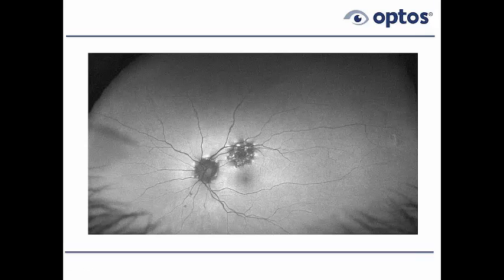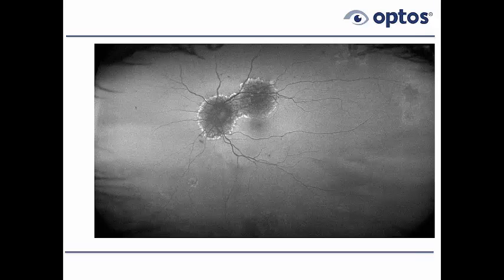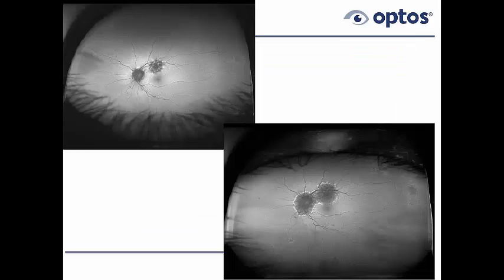So the point is, we had the diagnosis. We had OCTs in addition to the autofluorescence, and we told the patient, let's take a look at you in about 6 to 8 weeks. Here she is about 6 or 7 weeks afterwards, and clearly it changed. We'll show you the comparison in just a moment. Now the disc is clearly involved. The lesion that started above the macula has now expanded to the disc, if you will. She does have photopsias, and she is complaining about a blind spot below her fixation.